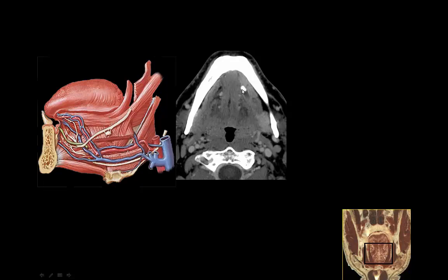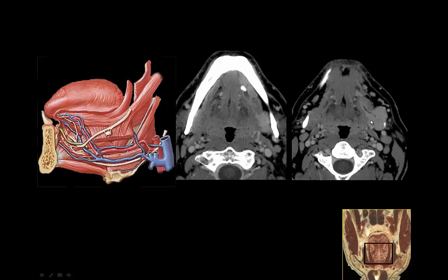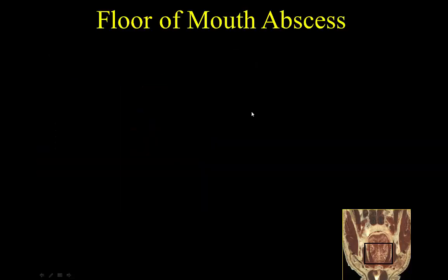So here's an example here. I don't know if I showed this before. A little guy right here presents with obstructive sialadenitis. So that's a little sialolith involved in the floor of mouth. I think I showed that one earlier, the little sialolith here.